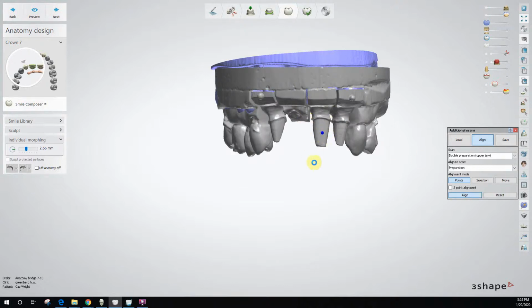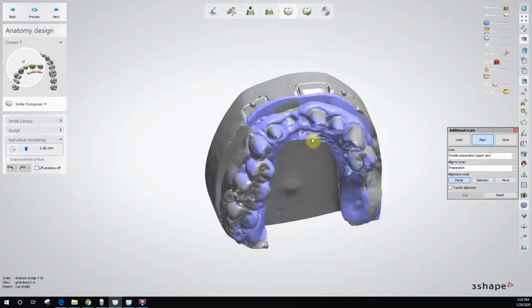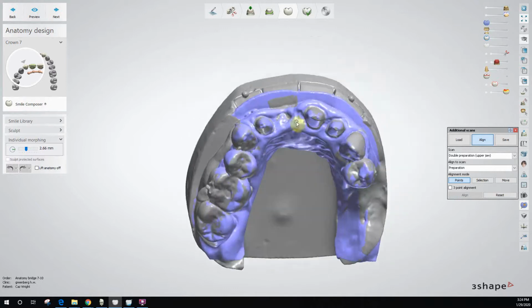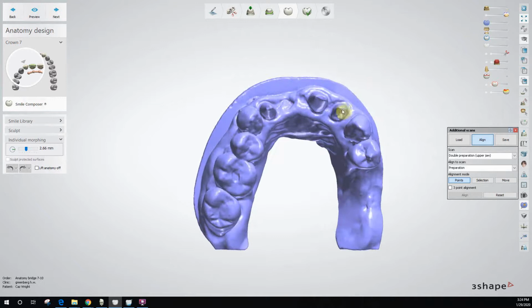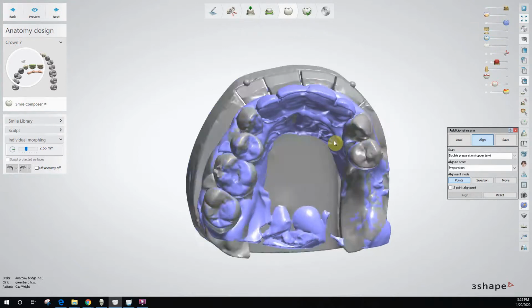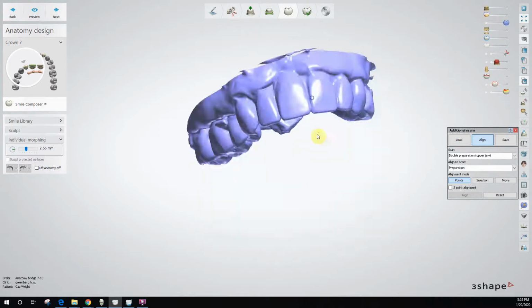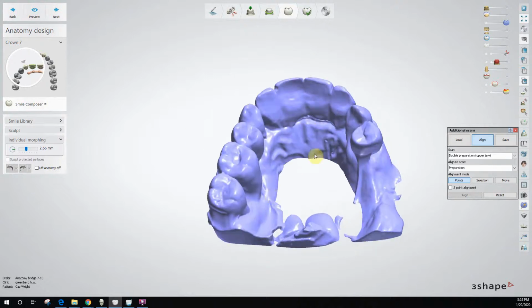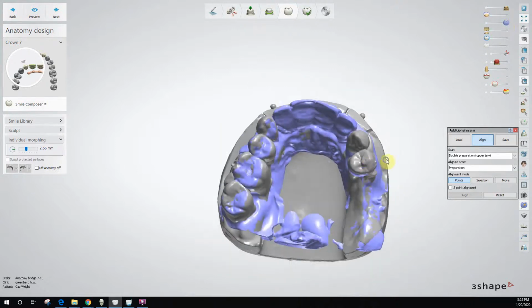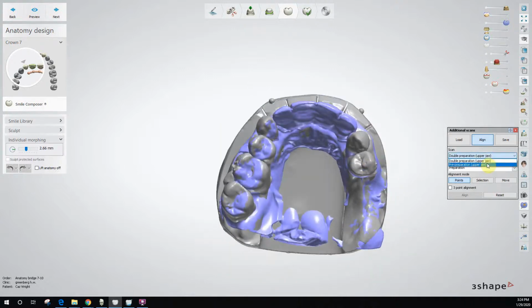I use my prep as an alignment tool. Now, on a full arch case, this is really helpful because you have nothing to align to but the preps. So you align to the preps, you turn off the working arch, and your pre-prep gives you something you can align your double preparation to, which is aligned to those preps. It gives you the ability to use the tissue to align your pre-preparation to that. Okay, but it's not quite lined up, so let's pre-prep, boom, and then move.